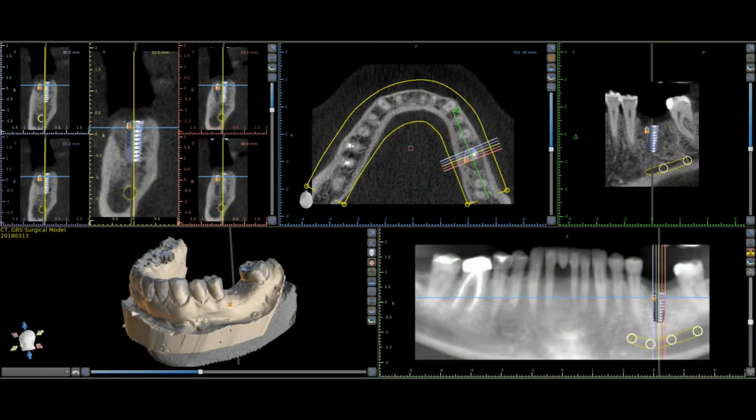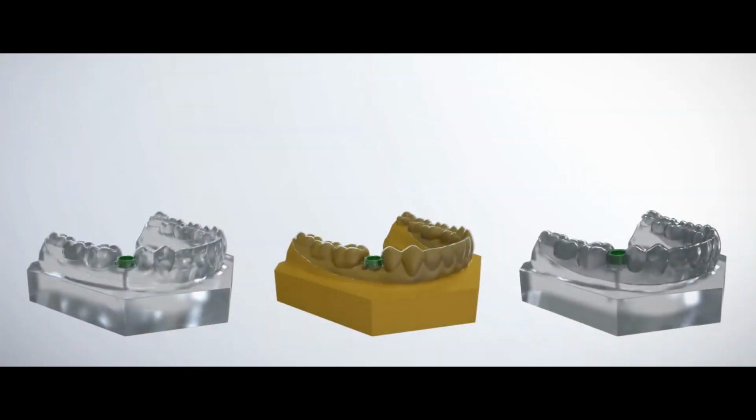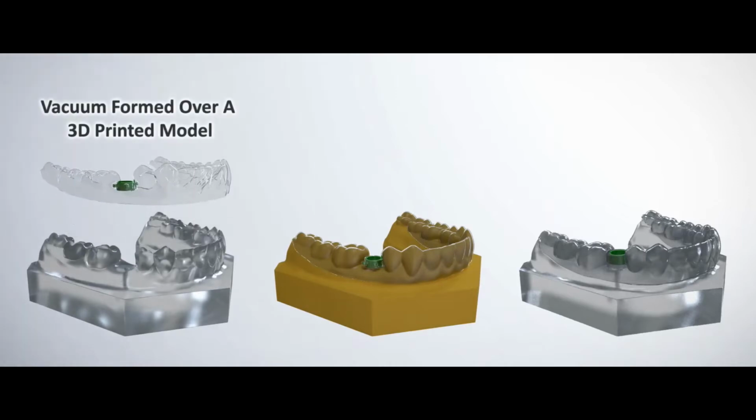Through the use of implant planning software, virtual implants can be positioned in an edentulous area to yield optimal functional and restorative results. Duplicating the planned case in a surgical environment is afforded through the use of a surgical guide in order to position the implants in the correct location, orientation, and depth.